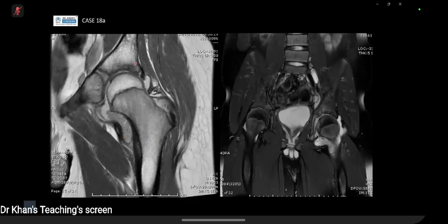Often in septic arthritis, there will be some extent of marrow edema, and of course, prolonging it without treatment, you start to get more in the way of bony destruction because of the inflammatory process. Now, in the MRI of the hip, we also look for other features. In this T2, there's probably irregularity of the chondral surface. It's probably just an incidental osteochondral lesion that's not associated with the underlying process.